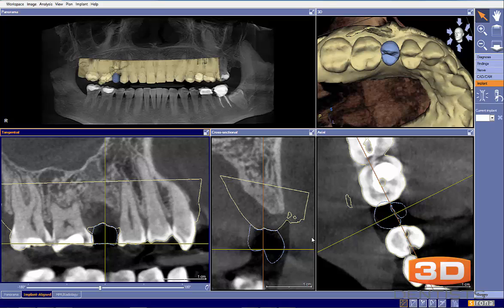Let's take a look. Today we were sent a case, and the notes mentioned that the dentist who sent the case is uncomfortable with this implant due to the defect on the palate and the need for the graft there. The particular question is, how do you plan this? How would you attempt to correct this if you were to do it? And then in his particular case, he wants to send it to his surgical specialist, but he wants to ensure that the implant's placed in a way that he can get a screw retained restoration.